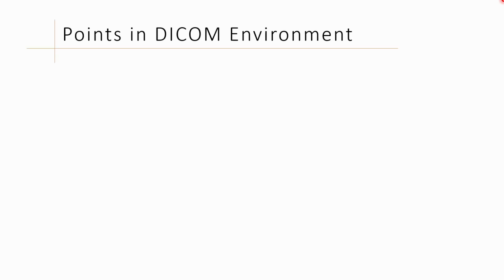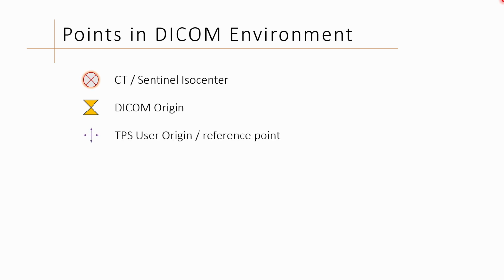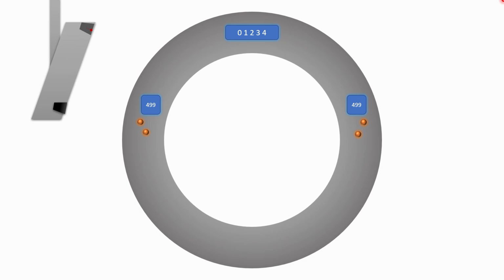In this video, I will speak about several points in the DICOM environment, which are the CT and the Sentinel isocenter, the DICOM origin, the TPS user origin, or also called reference point, and of course the treatment isocenter. And here our CT and Sentinel systems already roll in to get ready.